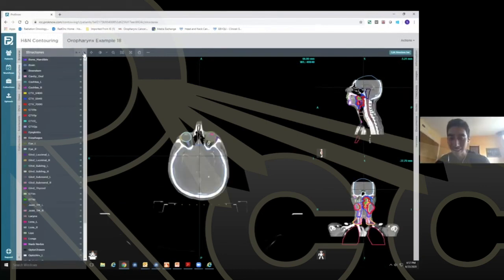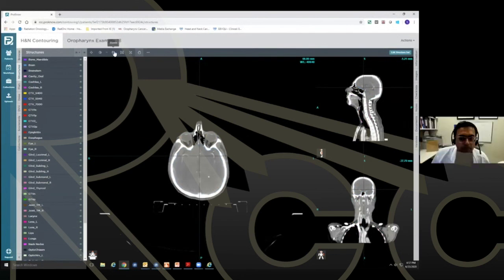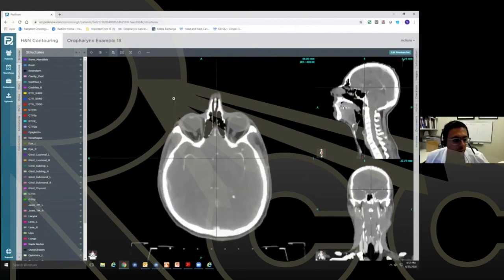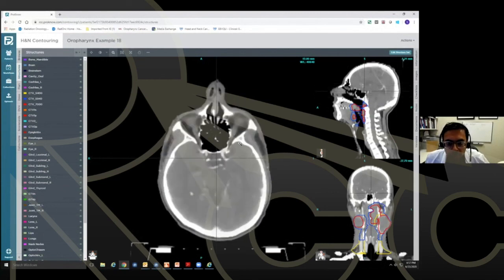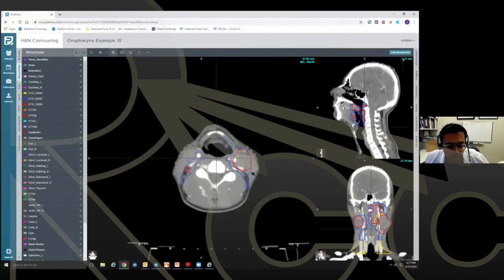Again, I'm going to pull up our CTVs in this case. Let's go down. Okay, so just bringing up the point again.